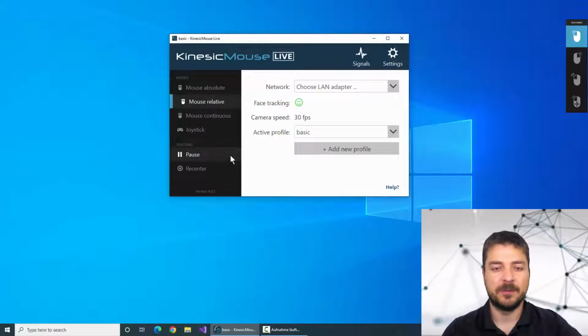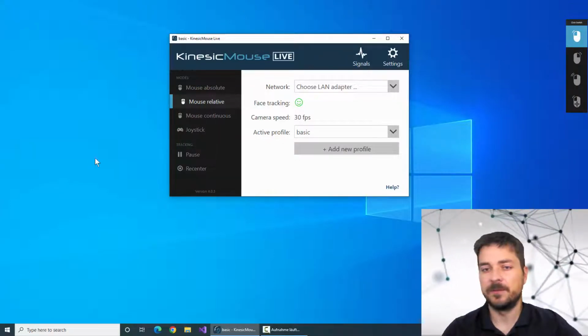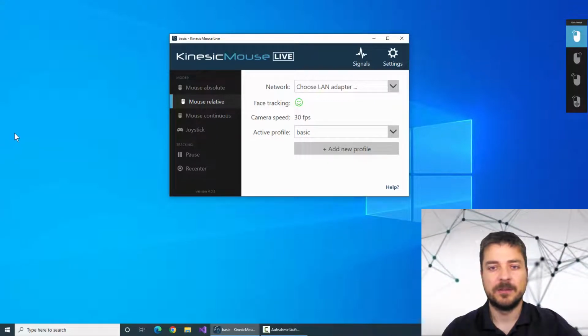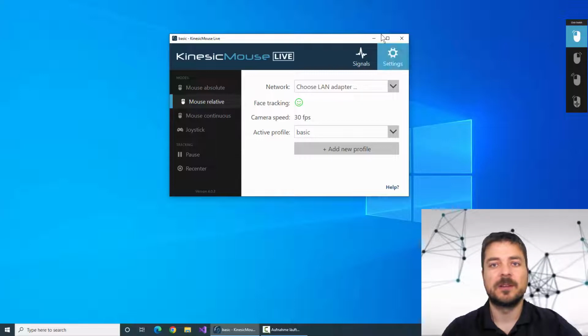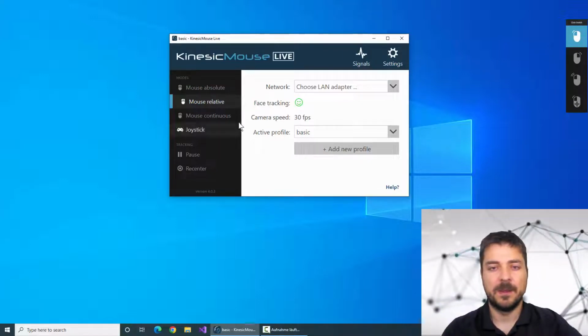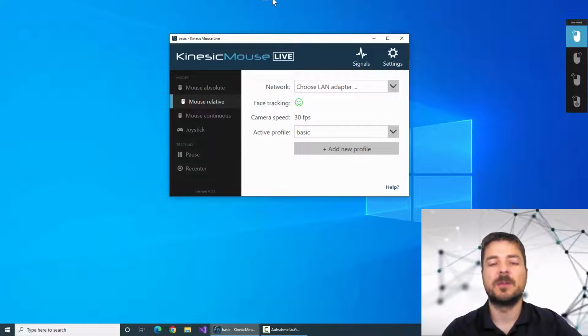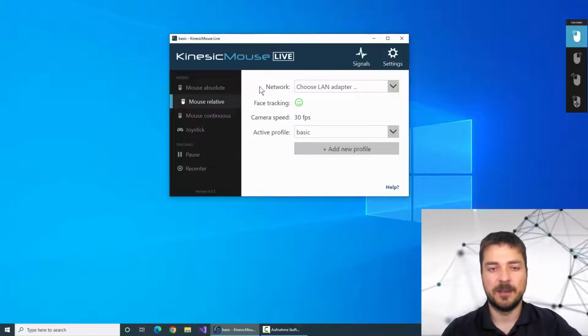So let's see how that looks when I push now against the screen edge and return my head to the center. You can see I'm fairly off. You can use this effect to recenter your mouse cursor, and you just have to try it a few times. Might be difficult in the beginning, but you will get the hang of it.